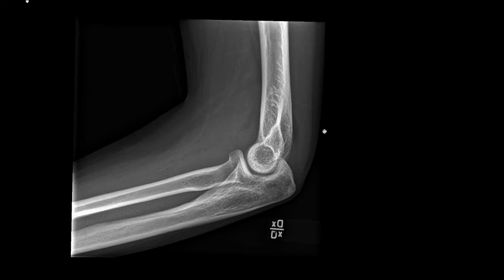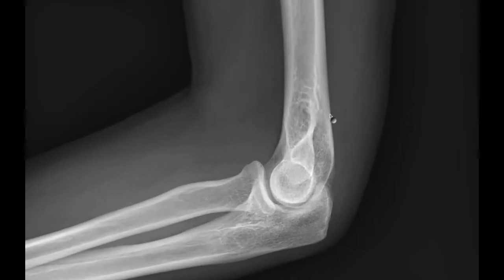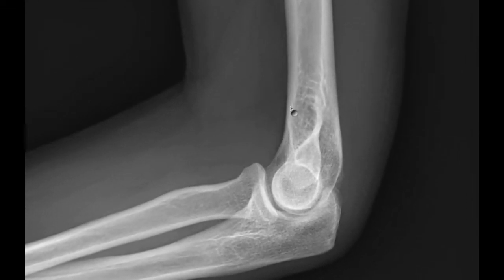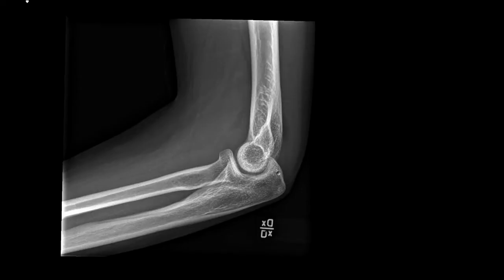So when you see a big thing coming out here, oh boy, you have to be looking really carefully at the bones to not miss a fracture. You can see here that there's nothing. There are no black spaces behind, and there's a thin line here, which is normal. This is a thin line, and it's completely normal. So this is normal, and this one is pathological.